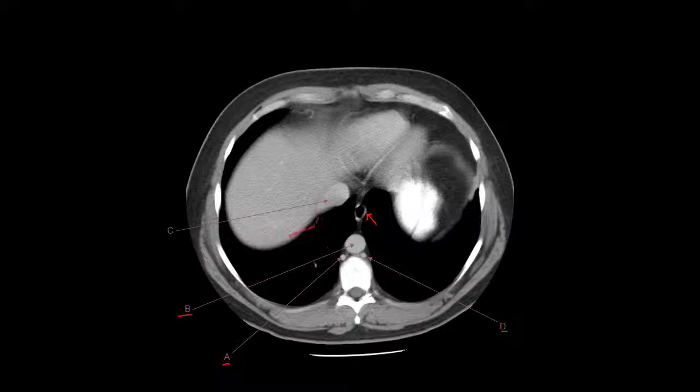Well, if we got liver, we know that, right? So we keep on scanning down. Here's liver, okay? Just to look on the left side really quick, what is this structure right here? I got a lot of white stuff through here. And that's oral contrast. Notice the bright white color to it. It's right below the diaphragm on the left side. It has a bunch of oral contrast in it. That's your stomach. Okay? So we got esophagus, stomach, we got aorta, we got the azygos and hemiazygos veins.